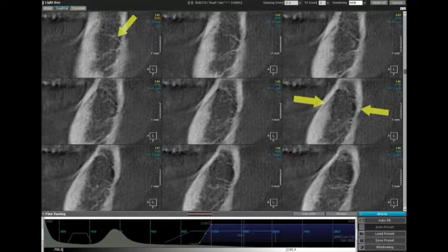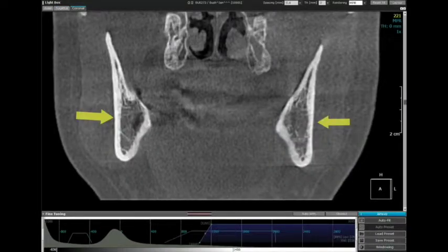I look at that big one at the back, and these are just going from more posterior to more anterior, and you can see you can get any type of display you want in there. Still thin section. I can't tell if that's it. I tried to compare that side to that side. I'm not impressed that there's anything going on there. And I don't have to pick up a handpiece or a surgical drill and go in there.